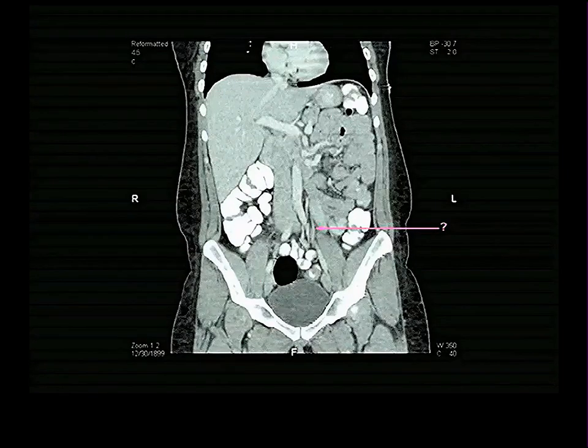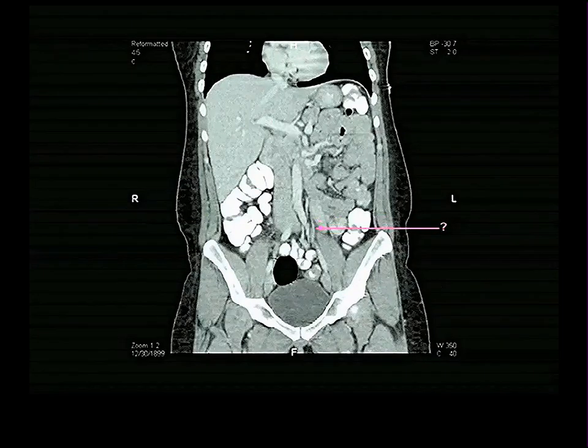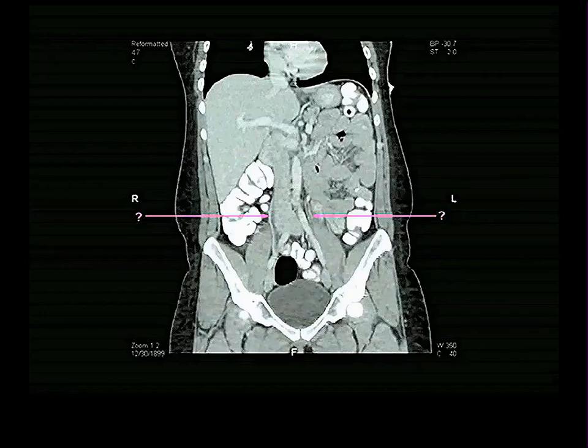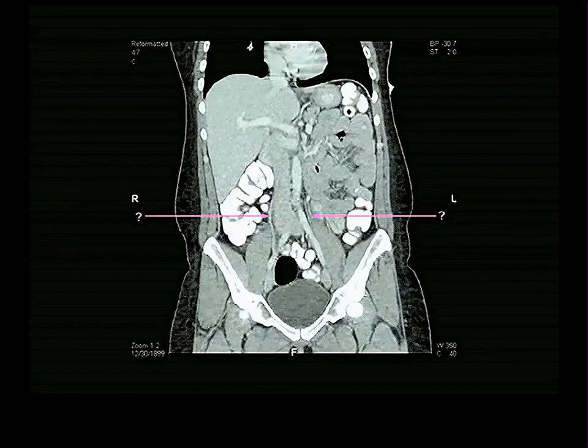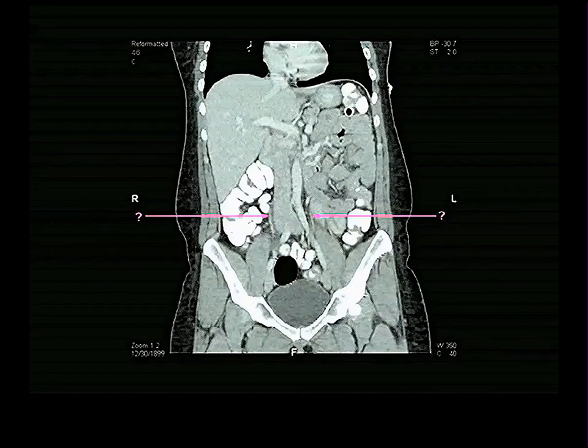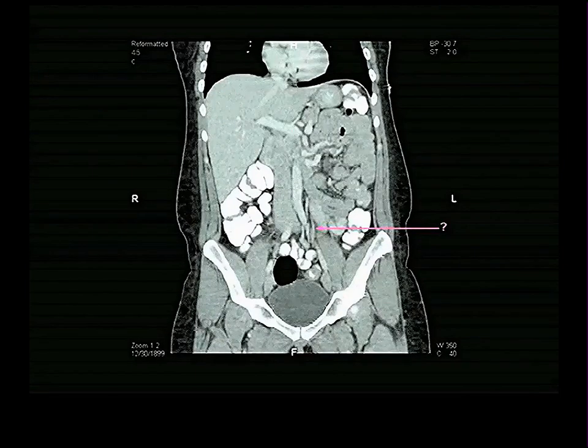A tricky thing. You can tell me what that is. Because it's one on either side. I've run into it, and now if I go backwards, and backwards I run into psoas. Now, I heard the word ureter come out, and that's a reasonable guess, although I doubt very much whether this is the ureter, because, and I'll tell you why, you see this thing here? It's crossing. Oh, that wouldn't be a good reason, would it? I wonder. I don't think it's the ureter.